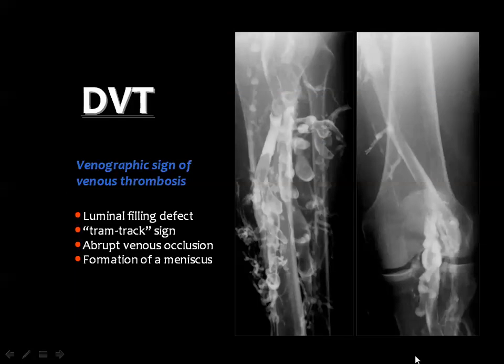And this is the conventional venogram showing multiple filling defects within the leg and thigh veins, diagnostic of acute venous thrombosis.